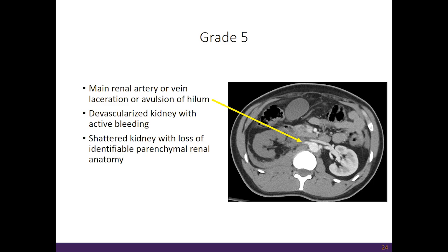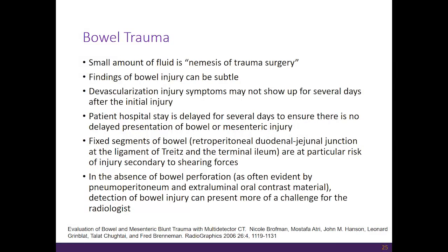grade 5 diagnosis. All right, moving our attention to bowel trauma. When we first started giving this lecture, I asked our head of trauma surgery about the subject of subtle bowel injury. And he said, well, that's the nemesis of trauma surgery. And basically, when we dictate on our CT scans, there's a small amount of fluid in the pelvis, can't exclude occult bowel injury. You basically put these patients in a black box because findings of bowel injury can be subtle.